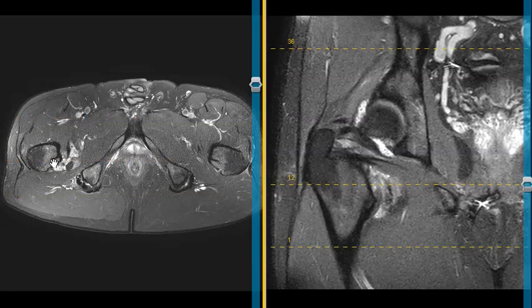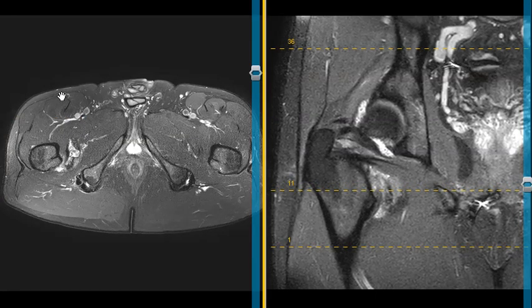Now in the axial view, we see the front here. This is the buttock region, the gluteus maximus muscle. This is the femur, and this bone here is the ischium. This bony protuberance is the ischial tuberosity. This looks like an inverted golf tee, and here where it's broad, the hamstring tendon is attached right here. These are the hamstring tendons attaching here.